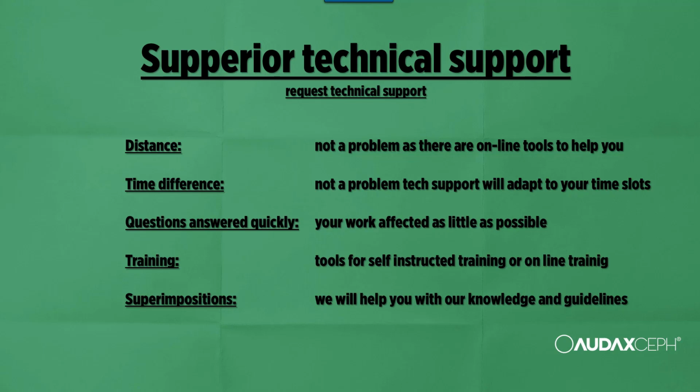Superimpositions are not done so frequently as analysis tracings, so somebody will need help, and Audax is here to help. We also provide guidelines, such as, for example, the ones for structural superimposition.